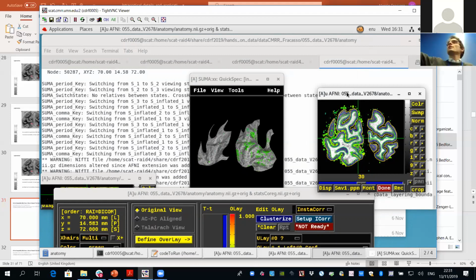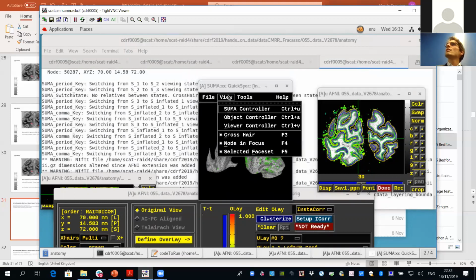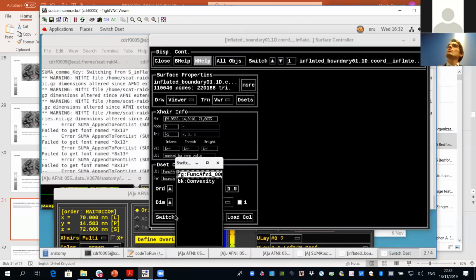And if you have a starting contrast like this, if you have a beautiful contrast, then really you can basically, well, not completely avoid the manual correction, but you limit it a lot. And the nice thing here, again, is just to show the flexibility between surface activity and then some of the profiles that I'm going to show you.